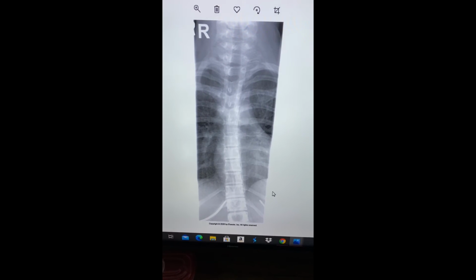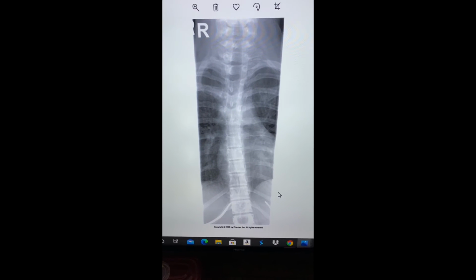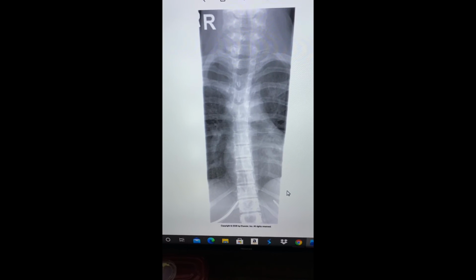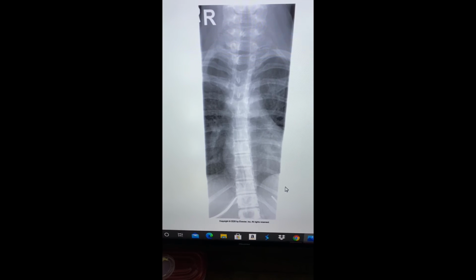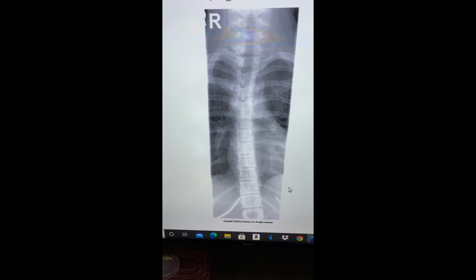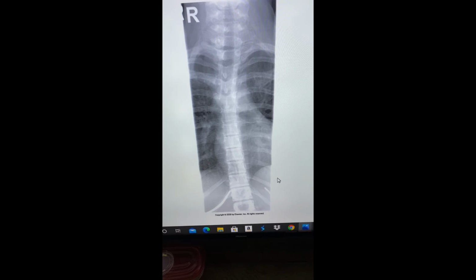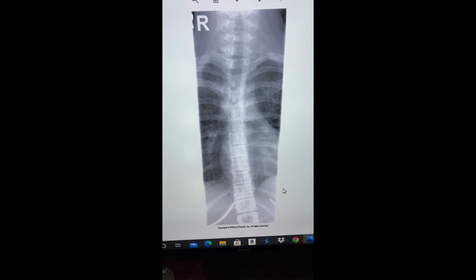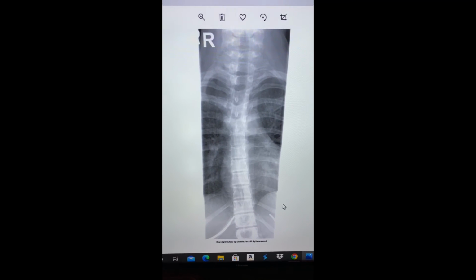Let's talk about required anatomy. All the anatomy that you want to see is from C7 to L1. L1 is slightly cut off, but if we're talking about required anatomy and you cut off L1, I personally wouldn't repeat it because of that, mainly because you're looking at the T-spine. If there was trauma also to the lower lumbar part of the spine, I would repeat that, but you're going to have overlap because you're most likely going to do a lumbar spine. But required anatomy is on there.